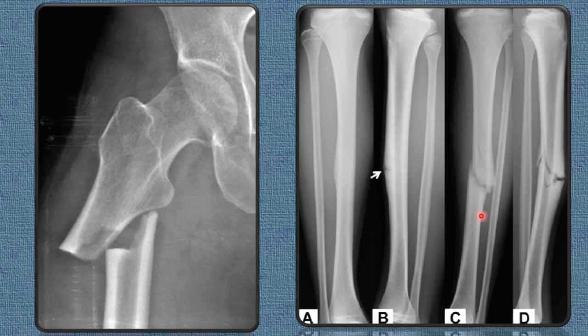And this is a spiral fracture, right? And this is a comminuted fracture, displaced fracture and spiral. So I think you will be a bit familiar with X-rays now. This patient is not growing, huh? Look, they are fused. Growth plates are fused.